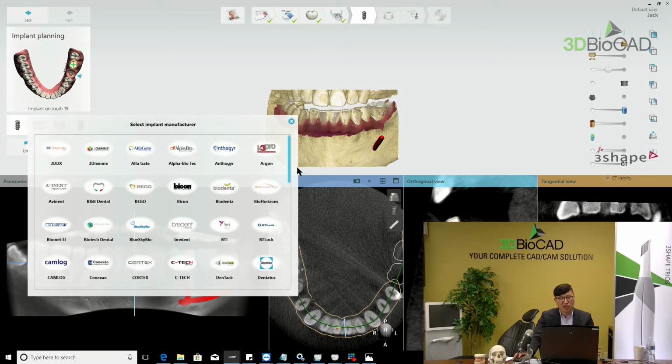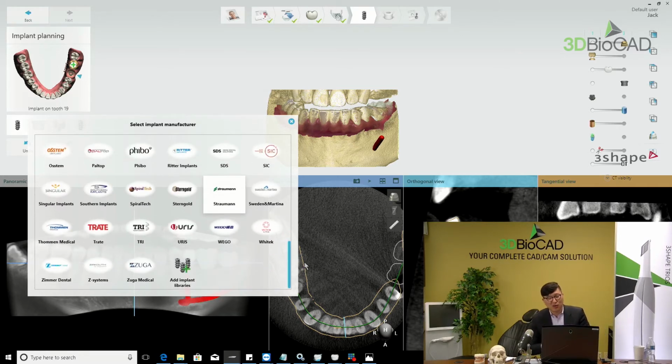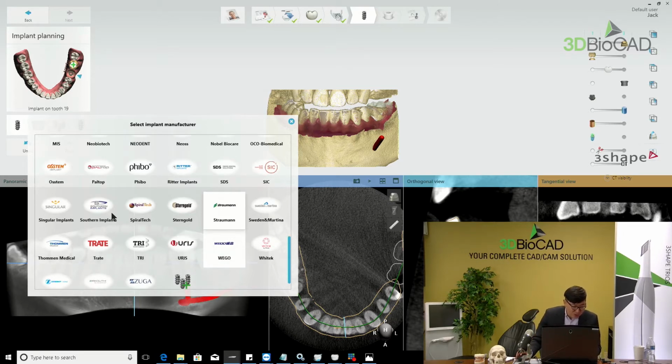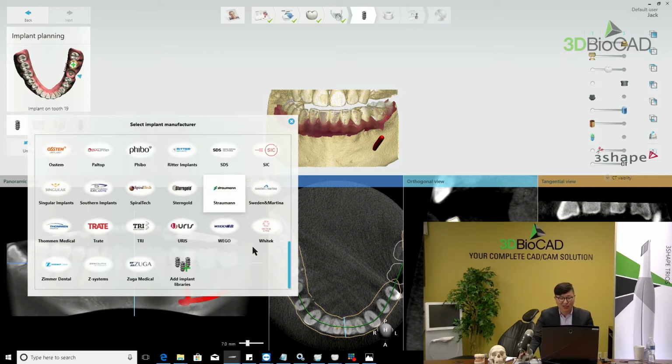Just ask your doctor which implant the doctor prefers to put in. I love all kinds of implant companies, but in this location in the Seattle, Washington area, the doctors who send me surgical guides use Nobel Biocare, Straumann, Hiossen, Dentium, and a lot more companies like Zimmer, 3i, but mostly I need to choose one. I'm not really marketing the implant, but let me just use this.